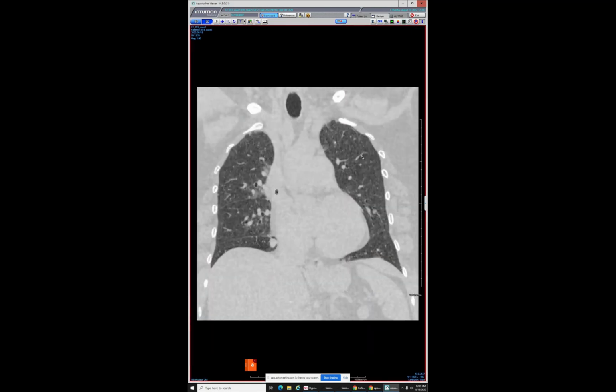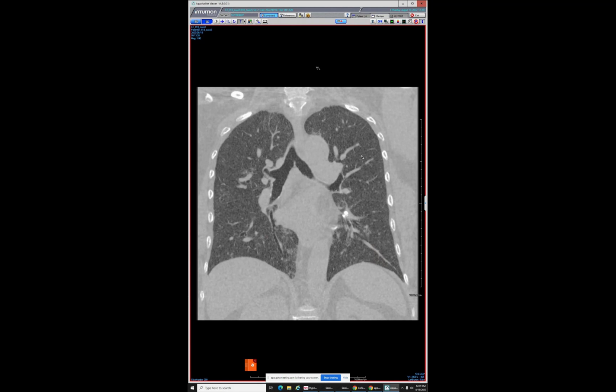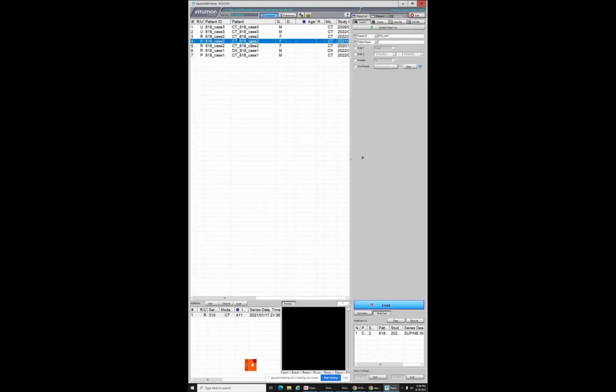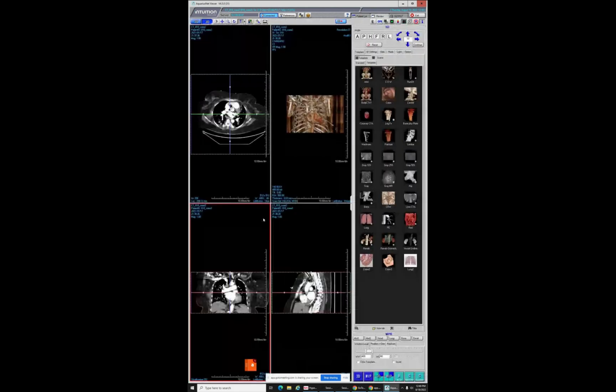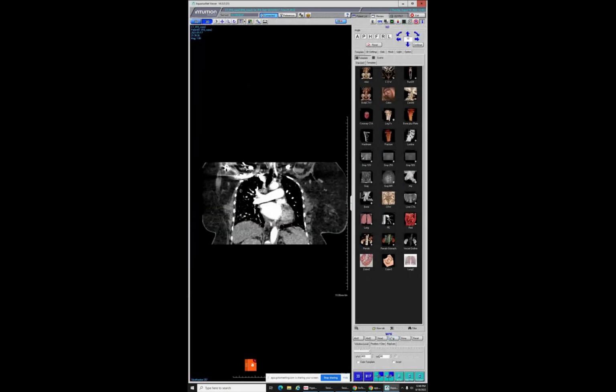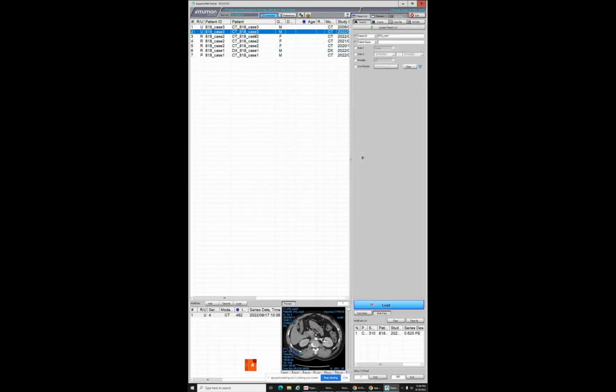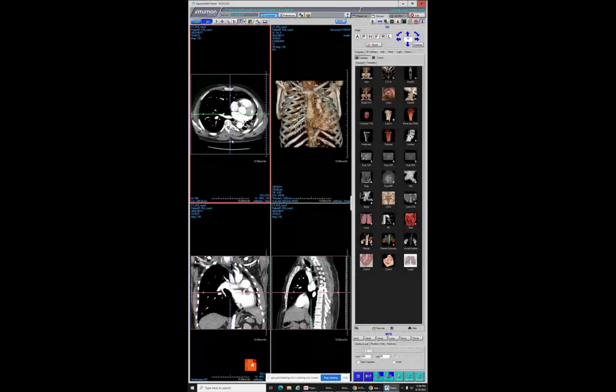And I'll show another thing. The lung volumes also are dramatically improved, as you would expect. I just did a volumetric assessment of the lungs for my own interest, and the lungs have nearly doubled in volume since she was in this state, because the main component of this injury is lung collapse, and her lungs have really rebounded. So anyways, I really like seeing those follow-ups. Too often it's people going on to transplant or totally destroyed lungs, and we forget that the lungs can repair themselves.